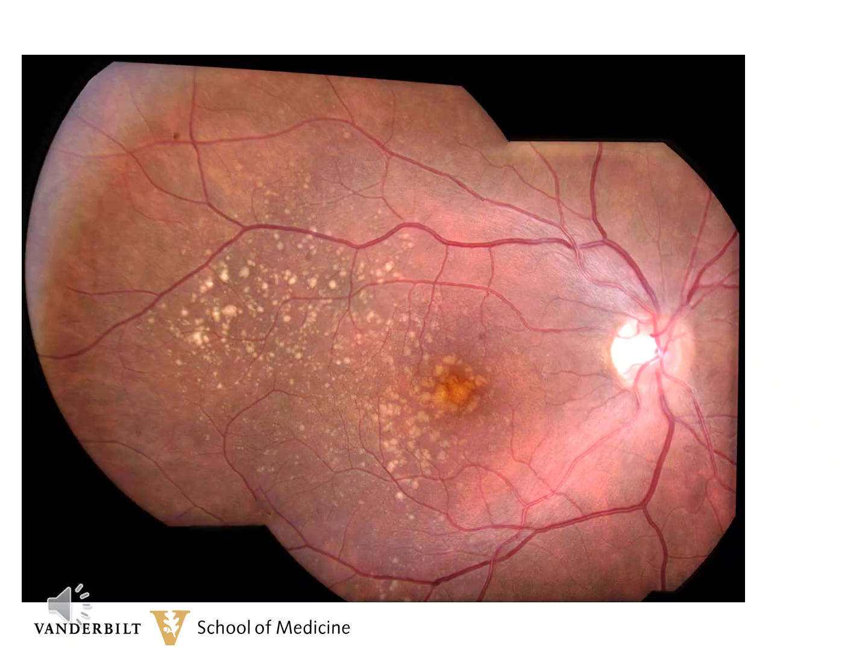Here's a patient with many medium-sized drusen. Drusen are under the pigment epithelium and are on Bruch's membrane. They can be yellow or white, and sometimes the pigment epithelium is thinned out over the surface of the drusen.